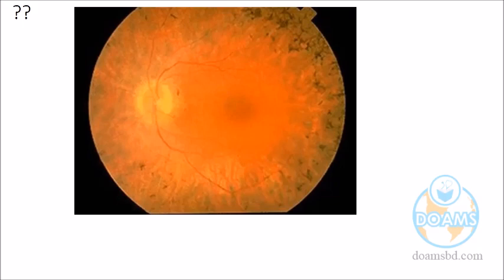How can you say that this is primary? It could be secondary or consecutive. What could be secondary or consecutive? Consecutive. Yes, this is the consecutive retina. This is the consecutive involvement of retinal disease or vascular disease. So this is retinal disease, retinitis pigmentosa. It is a disease of the retina that involves the optic nerve head, the optic disc. The appearance is waxy. So basically, three important features to remember: the bone spicule appearance, attenuated vessels, and the waxy disc. Right? This is retinitis pigmentosa.